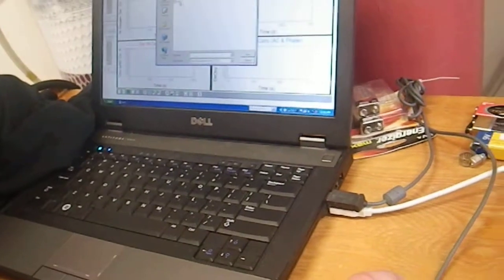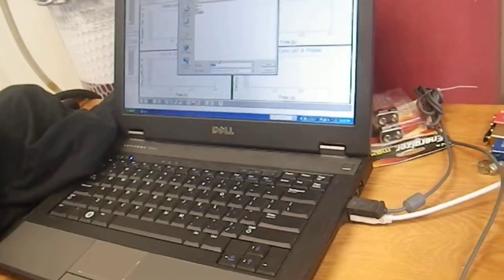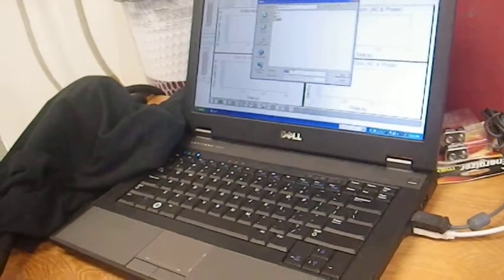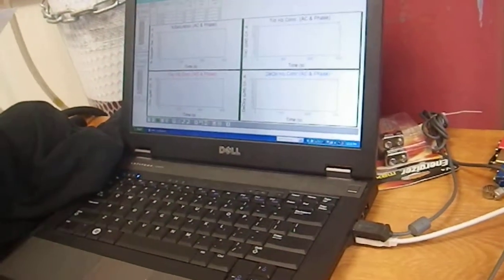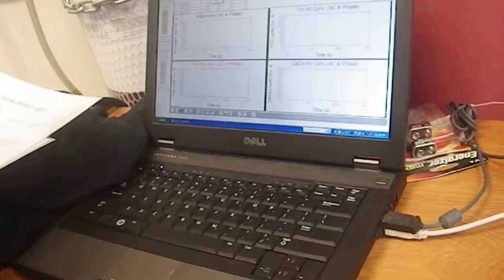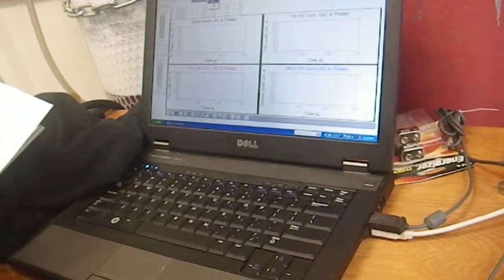So go playback, you'll go to your file, so here it is. You'll take this file name and copy it, because usually it'll be a bunch of numbers. You don't have to, but when you go to save your text file, you have to type in the text file name, so you might as well just copy it here. So you go open, and then you have these buttons here. You want to go to display, data table, new. Display, data table. Or sorry, open, I mean, not new.